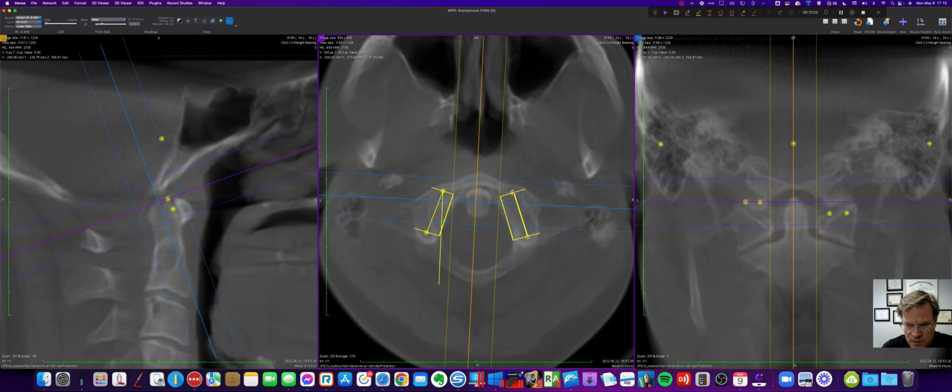Good. A lot of times I'll take those out. You hit the space bar to do that, just so I don't accidentally grab it, because if you grab the middlemost line here, you can see how this turns into a rotating. Now suddenly everything turns and you've lost all that work you did, and you have to go back. Ask me how I know. Oh, look at that. That was pretty good. Pretty straight.